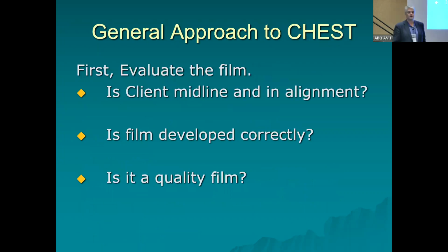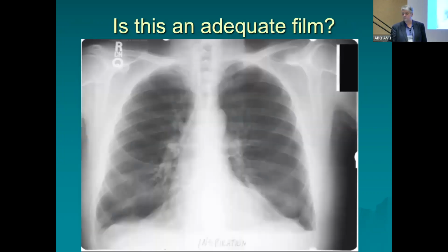So first approach we're going to take, by the way, I got a lot of party games in this one, so this is an interactive, I promise, one on this one. So hopefully we'll have a little fun as well. First question we always want to ask is, we want to evaluate the film: is the patient midline? Is the film developed correctly? And is it a good quality film?